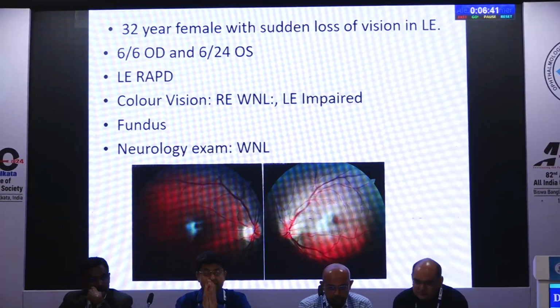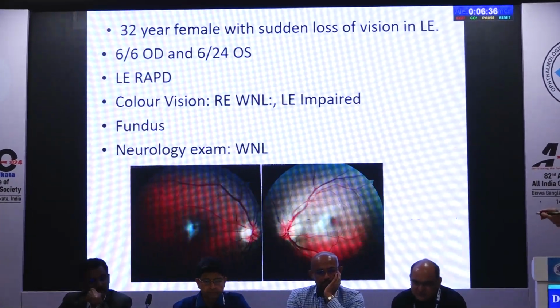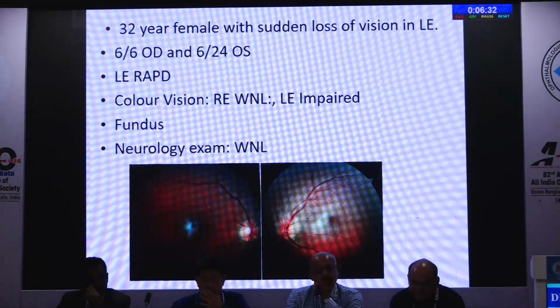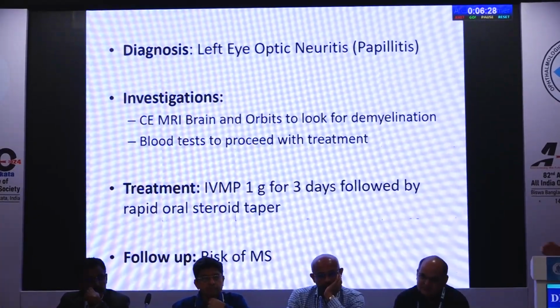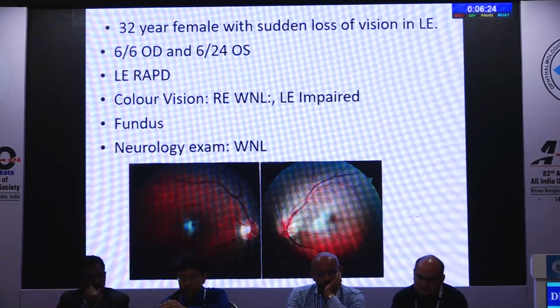And the fundus that we can see here is showing an edematous, hyperemic-looking disc. So this is similar to what Dr. Rohit had presented earlier, and these are cases of papillitis. So Professor Rohit, how would you investigate this patient, and what would you do about it next?